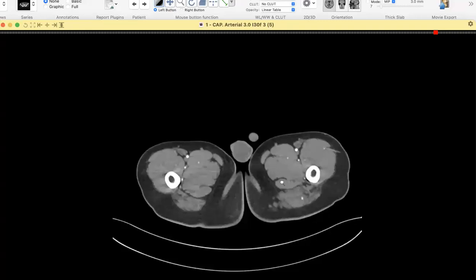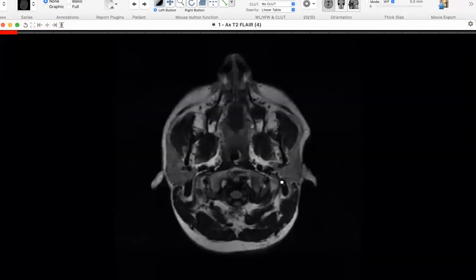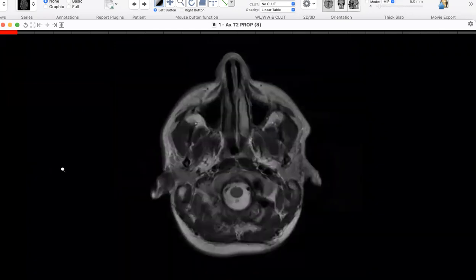Great spirit. All right. So this is a case of a 35-year-old male patient who presented with pinpoint pupils and seizures. You want to request remote control? Yeah, sure. All right. Let's see how you manage to scroll. Okay. So I'm given a 35-year-old male patient MR, pinpoint pupil and seizures.